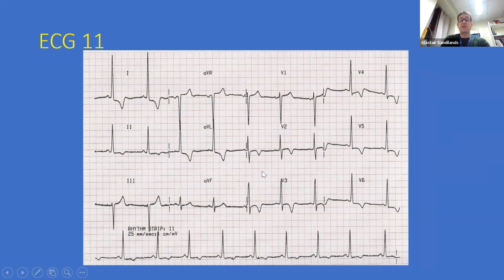And this is an actual ECG from someone with hypertrophic cardiomyopathy. In hypertrophic cardiomyopathy, you've got T wave changes. These are the repolarization abnormalities associated with the structural heart disease, but there is evidence of very tall R waves. So it has got to be left ventricular hypertrophy here, but this pattern is particular of hypertrophic cardiomyopathy. Okay.